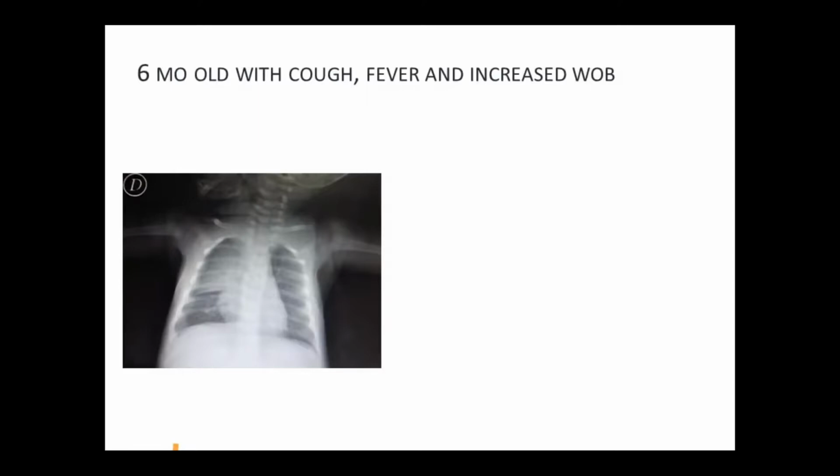You ascertain that this film is that of your patient's. You note that penetration and inspiration are adequate, as the vertebral bodies are visible through the heart and that approximately 8 to 9 posterior ribs are visible. You conclude that the rotation is normal, as the clavicles are equidistant from the spine. Now, you can begin interpreting the film using the top-to-bottom approach.